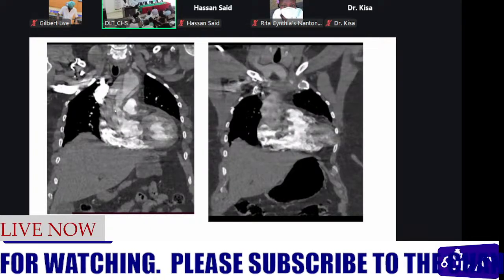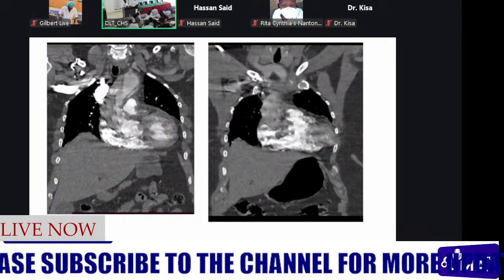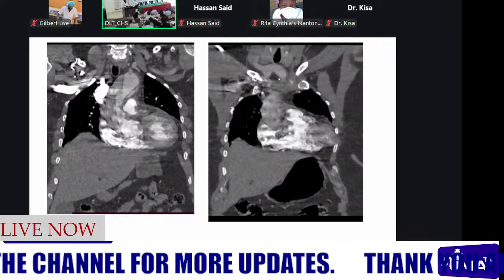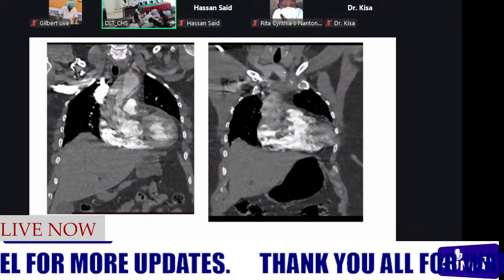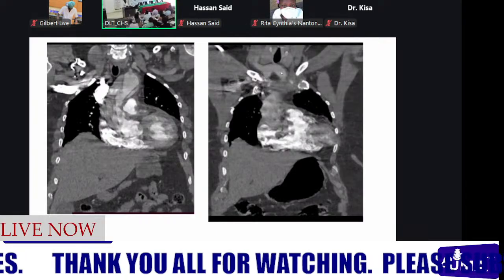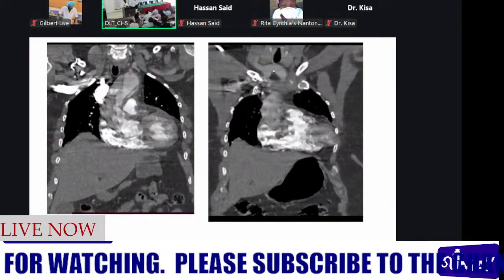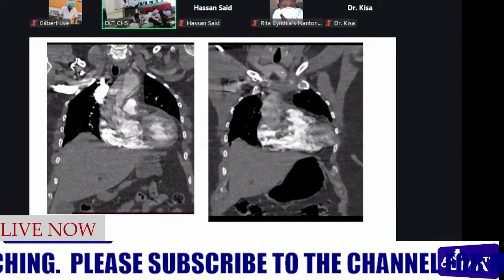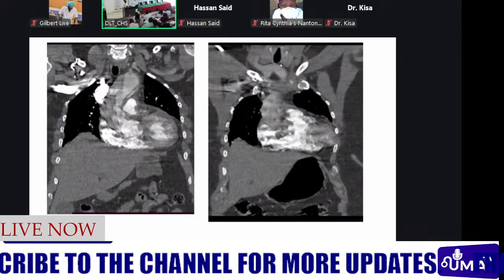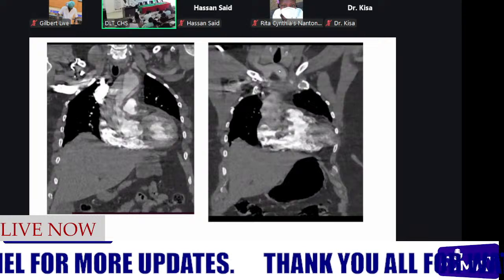The aortic root was measuring about 4.3 centimeters, which was increased, but it couldn't qualify as an aneurysm. Then in this other image, I wanted to show us the extension of the dissection. This is our first branch of the aortic arch, which is the brachiocephalic trunk. And still we are able to appreciate a large true lumen, which is also bordered by this hypodensity, which is our false lumen. So the dissection was actually extending cranially into the brachiocephalic trunk.